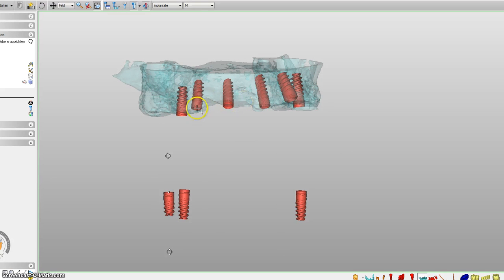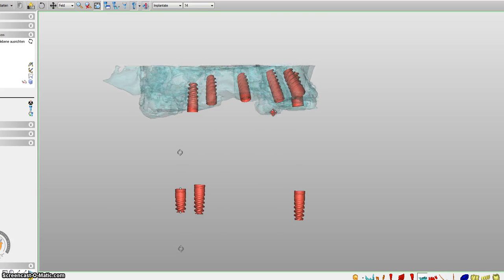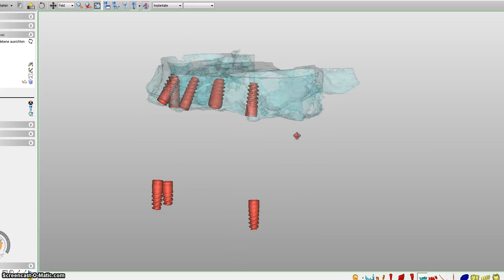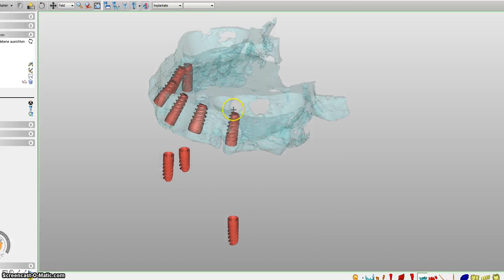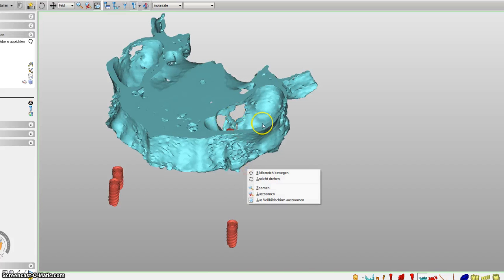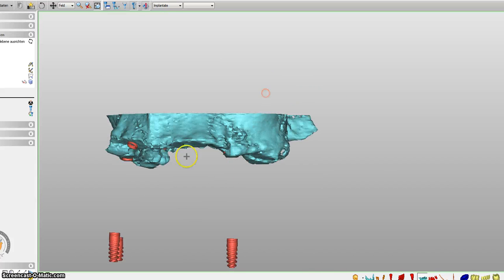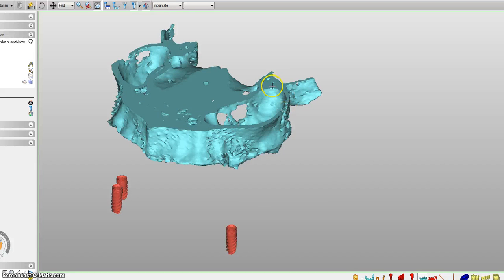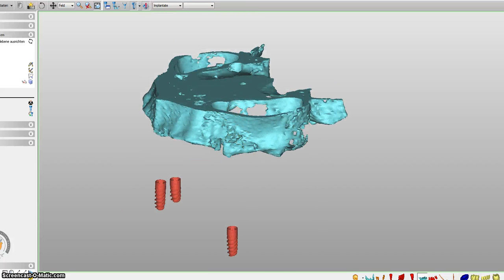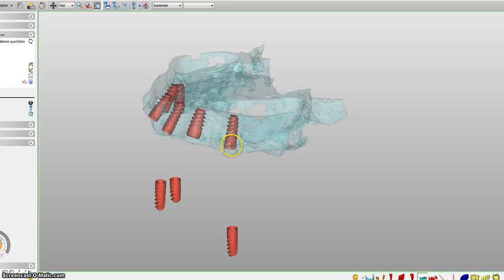Okay, you still have quite good bone left, so there is no problem in placing all the implants. We will have 3 on your right side and 3 on your left side. One thing that I have to talk to you about is that everybody has in his upper jaw a sinus. Yeah, you can see this here. It is right above the mouth. It is a cave basically filled with air, and when we want to place implants in the back here, we have to choose a certain length. Okay, these implants have to be at least 10 millimeters.